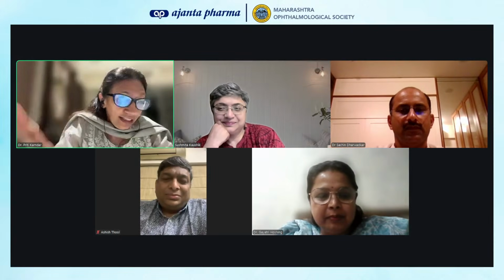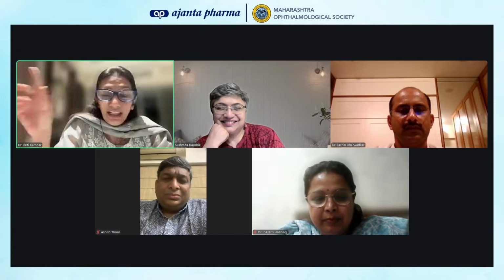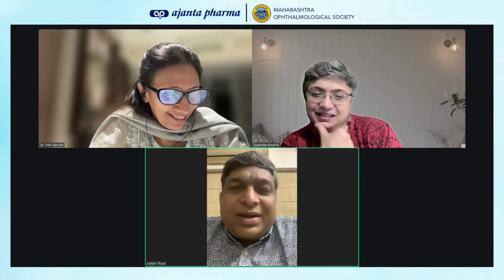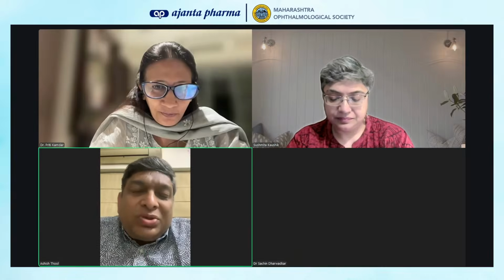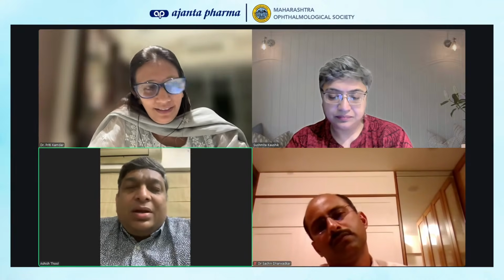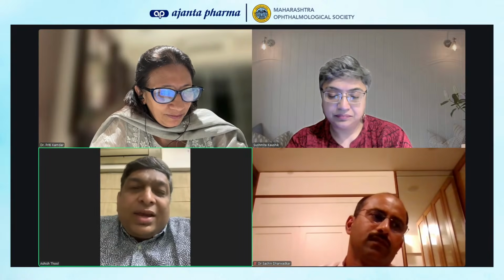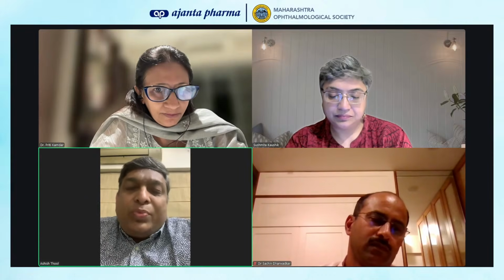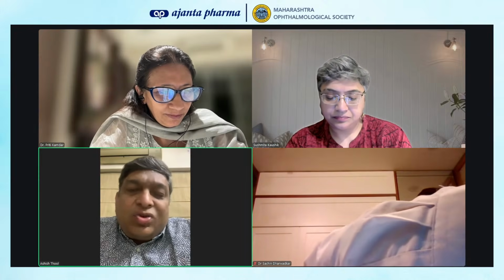Okay, red disease, yellow, red, green, and yellow disease. That's what the question is. If any of you can elaborate, Dr. Ashish? It's basically to differentiate between what is normal and what is abnormal. If you look only at the OCT printout, like we talk for fields, you will always be making the mistake of diagnosing a red or a green disease. If you, on the other hand, give importance to your clinical judgment, the dilated disc evaluation with your stereoscopic lens, and then correlate it with a good quality image on the OCT, this red and green disease is not going to bother you.